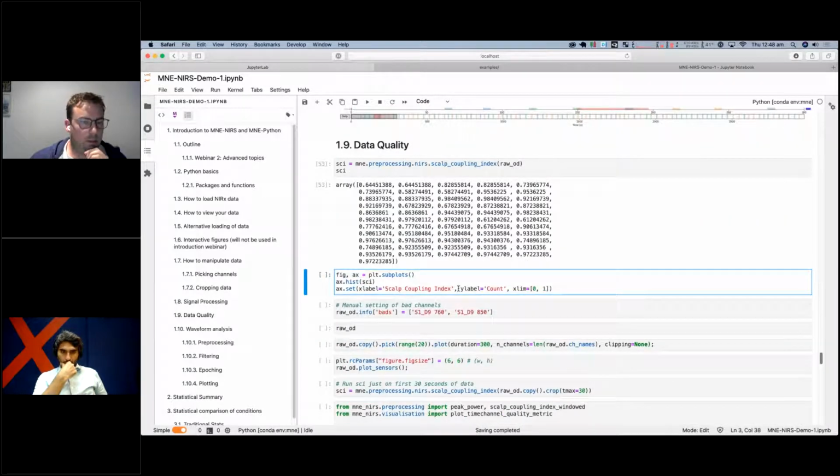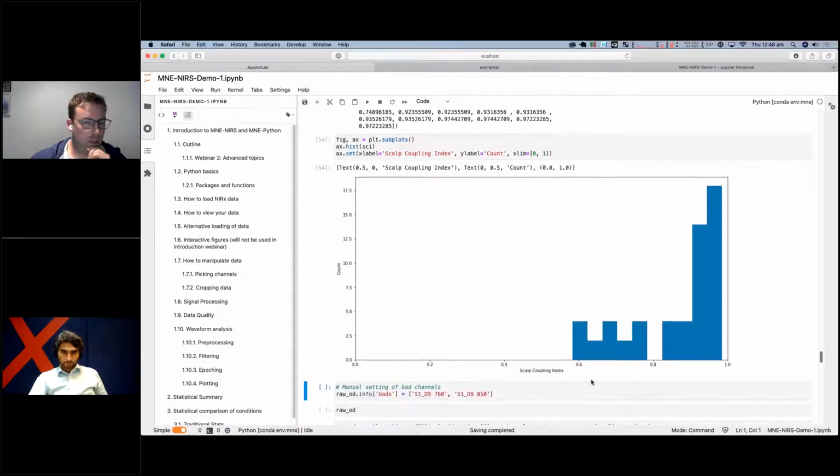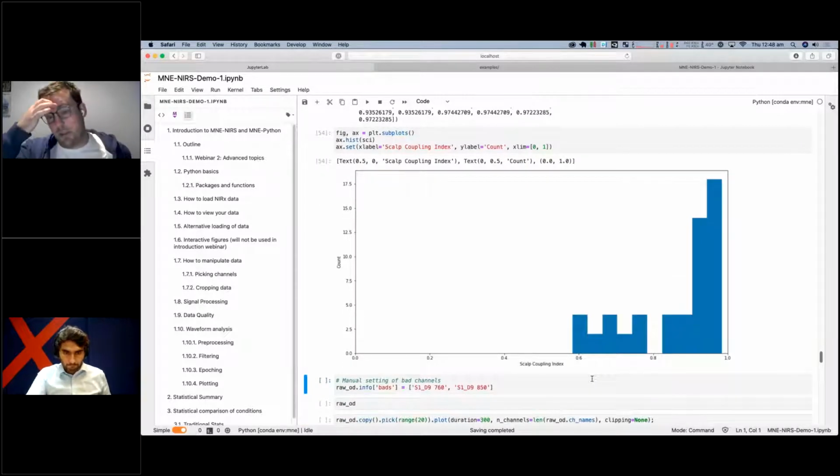We can plot that, of course. So most of these channels are good, and they have a few poorer channels. You can mark channels as bad. This is similar to before, when we marked a time segment as bad; you can also mark an entire channel as bad. And I found this to be quite useful when we do cochlear implant research.